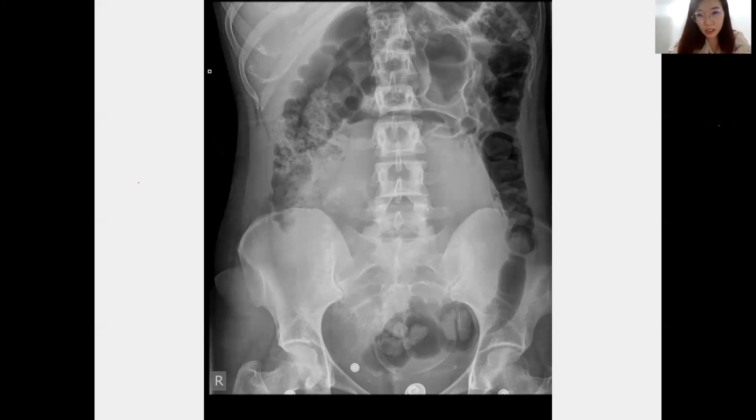No, you can still see haustral within it. It's not lead pipe. What's lead pipe? Lead pipe, ulcerative colitis. Lead pipe sign. Loss of haustral, but there's still large bowel diverticulum. Rarely we will see diverticulum on X-ray. The one specifically on barium enema, then we can see.